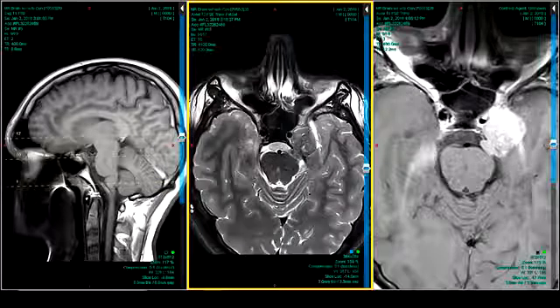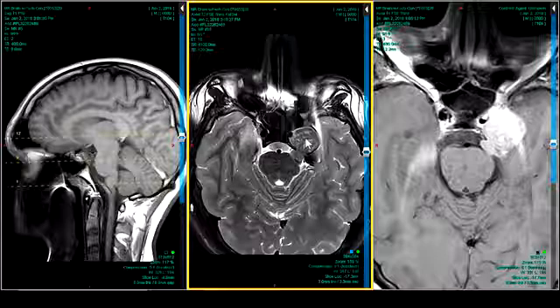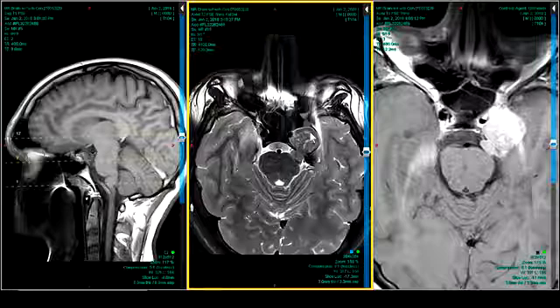But the classic or typical meningioma would be a gray lesion, kind of like this, with some speckled microcysts inside it. It might have a little spray of calcification, the so-called psammoma body. Remember that from histology, calcification? You might see that nicely on CT, harder to see on MRI.